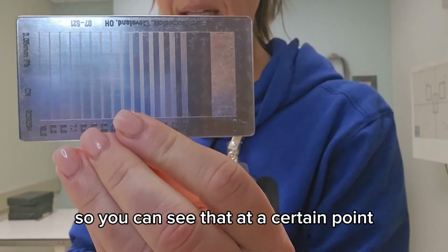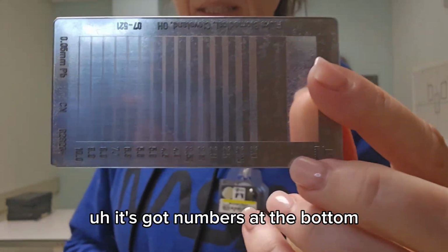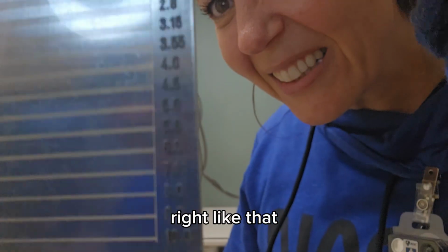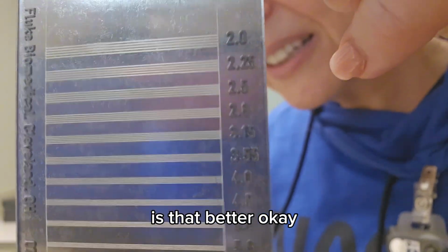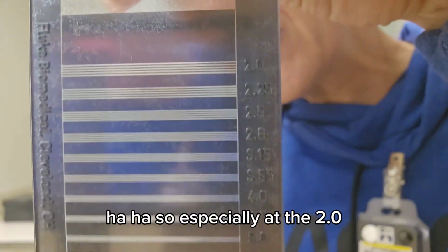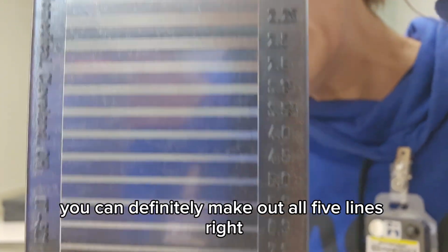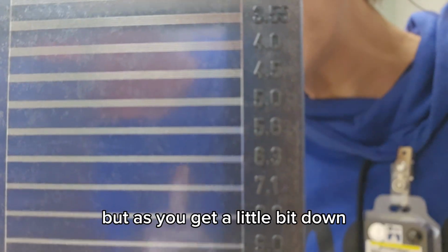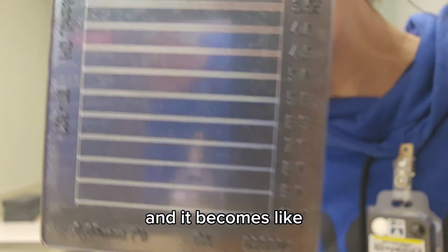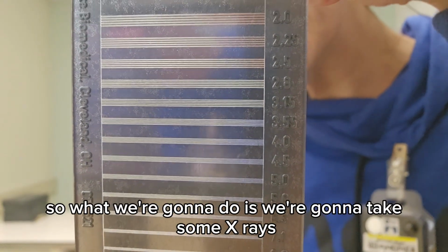So you can see that at a certain point, sorry, it's my nail, it's got numbers at the bottom. You see that? Right? Like that? Is that better? Okay. Is it backwards? No, it's good. So, especially at the 2.0, you can definitely make out all 5 lines, right? But as you get a little bit further down, they start to blur together and it becomes just a mass of gray, right?